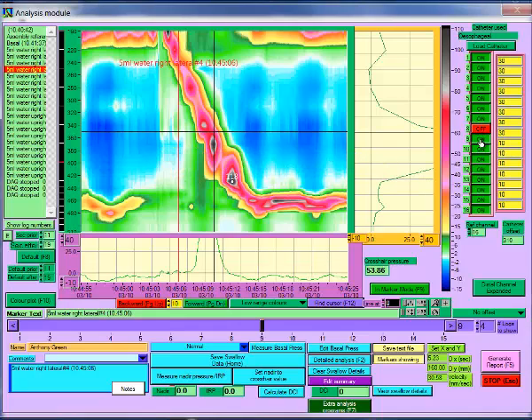When you turn a channel off, the channel in the catheter display turns red. The data is interpolated between the two data points on either side.